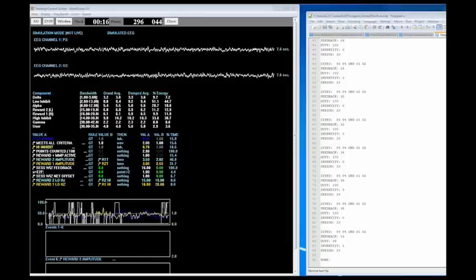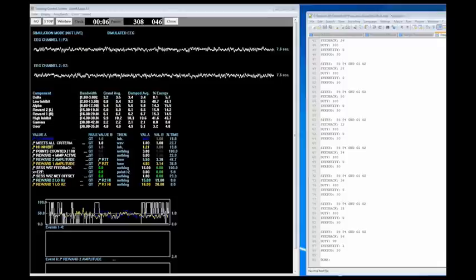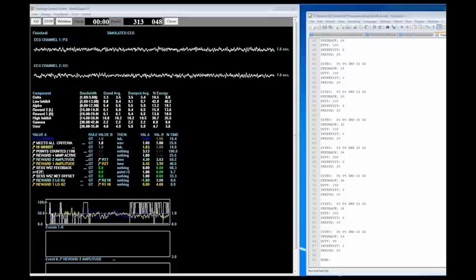So most mini-Q files you can actually rewrite, say how long you want to do it, and then just load it into a pre-existing Z-score PZOK or PZOK UL, whatever you use, and it will then train to the sites as you're jumping through them. Like I said, I believe on the knowledge base there is one that is already out there in existence.